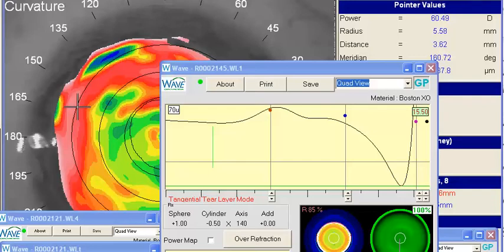I see from your clinical request you have a keratoconus patient who's post-PK and you're struggling with a bit of a pterygium problem. From your history, I see that you started with an on-K lens, a smaller diameter, that was decentering, and you progressed to a smaller scleral design, and now you're working on a larger scleral design, but still struggling with some tight peripheral curves. Well, let's take a look at your design.